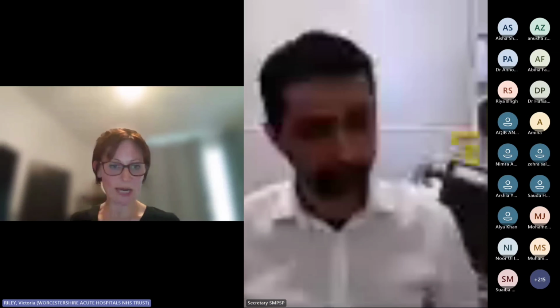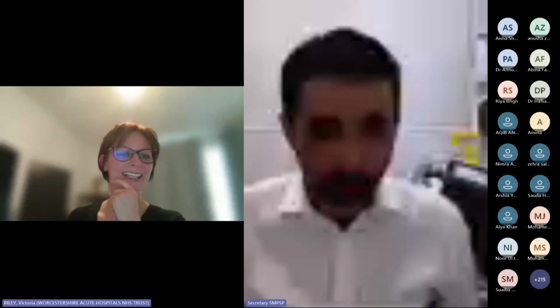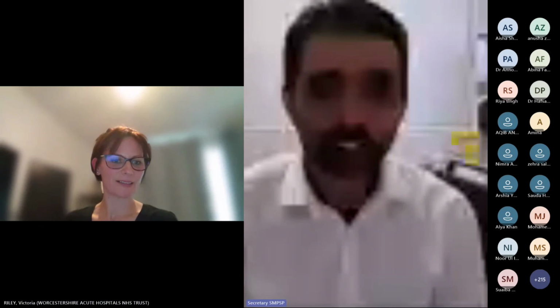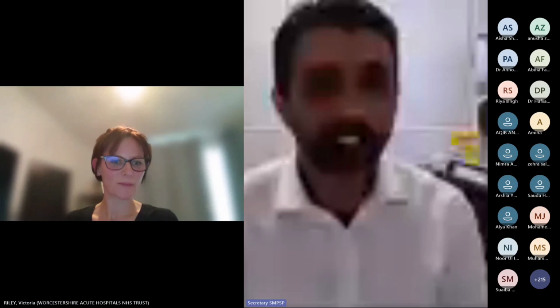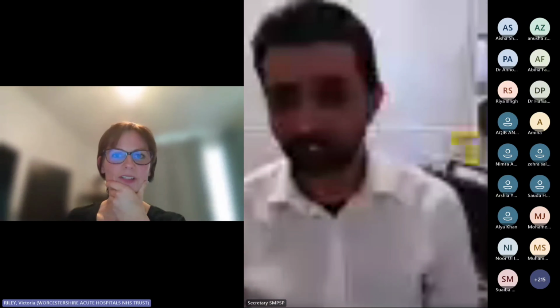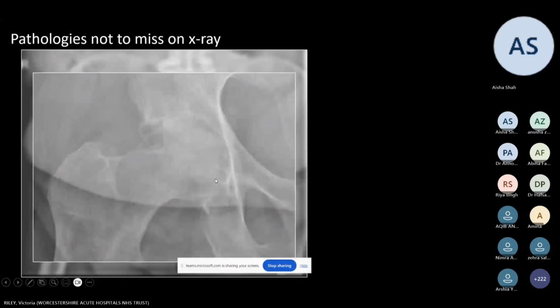I'm quite happy to, would you like me to share a couple of films of inflammatory arthropathy? Why not? Please do. Working in rheumatology, I would always like to see how it looks on the plain films. Right, I'll just share my screen with you again then. I think somebody has asked the same question on the chat box. What are the features of inflammatory arthritis on the X-ray?